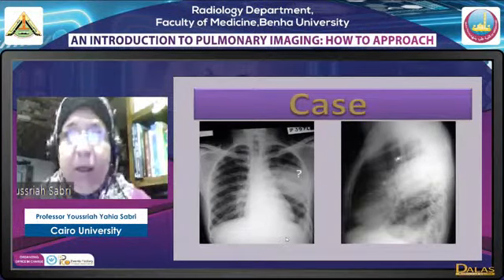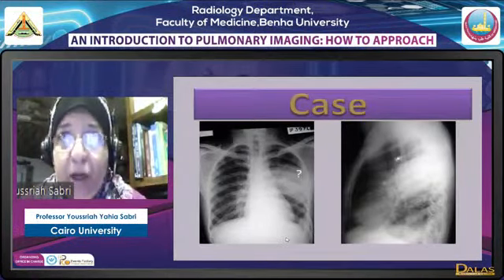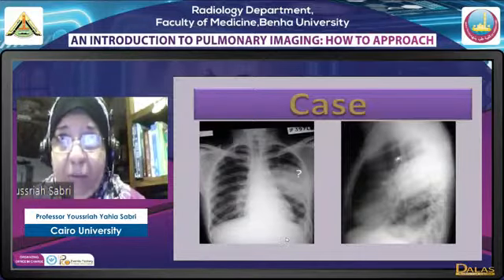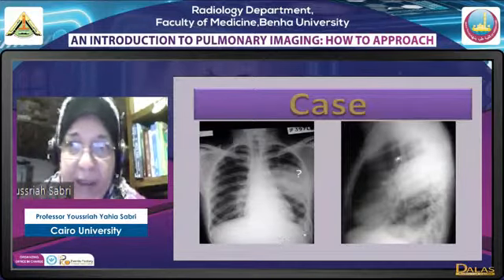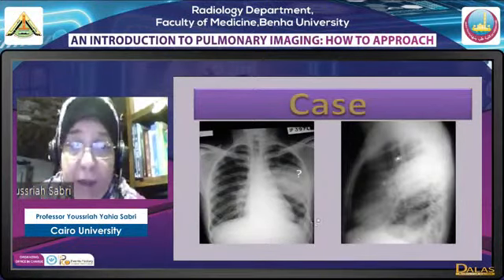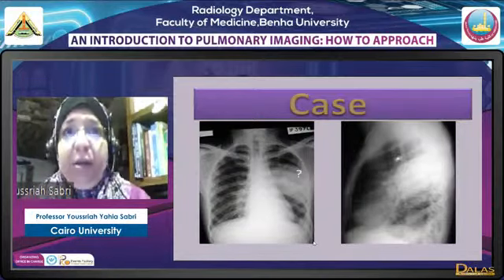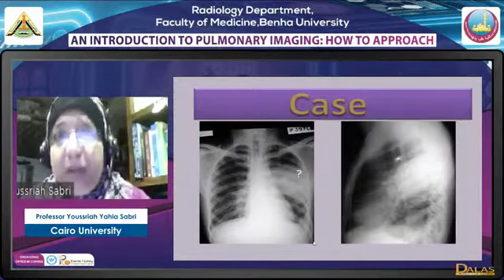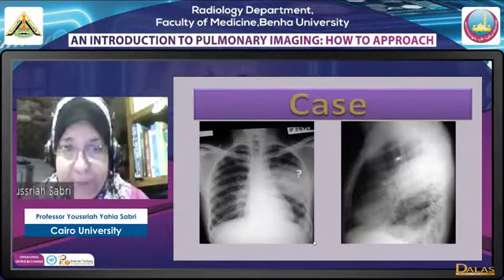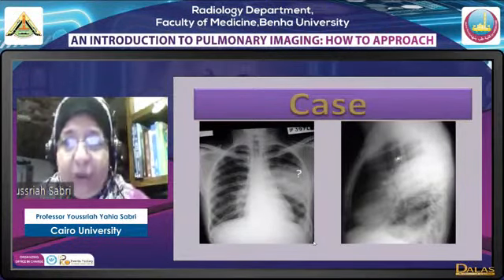These three points that we have just discussed: number one, change in the configuration from PA to lateral, one ill-defined, one well-defined. Number two, having a pleural relation, which is the major fissure here. Number three, an ipsilateral pleural lesion is also visible. These three findings suggest that we are dealing with a pleural lesion. Not the classic effusion and so on. This is a loculated effusion.